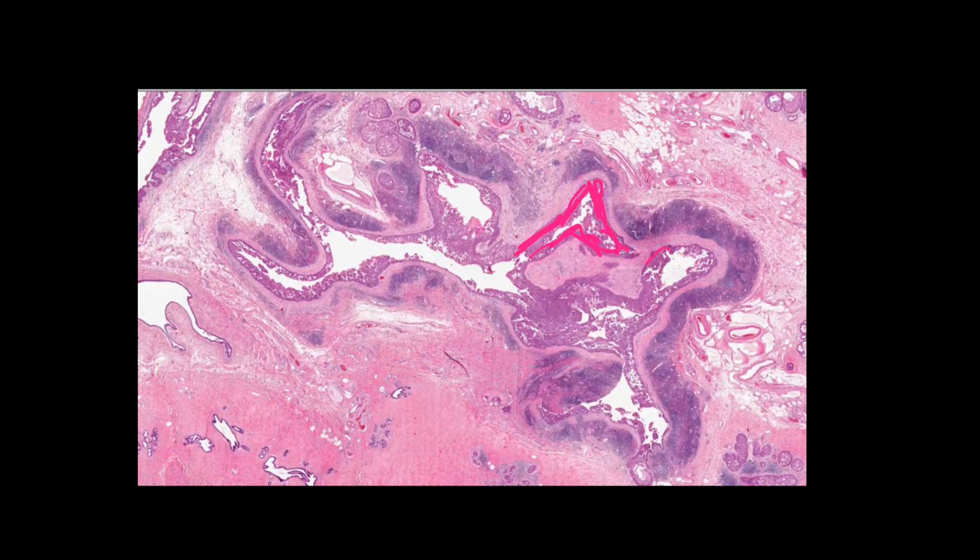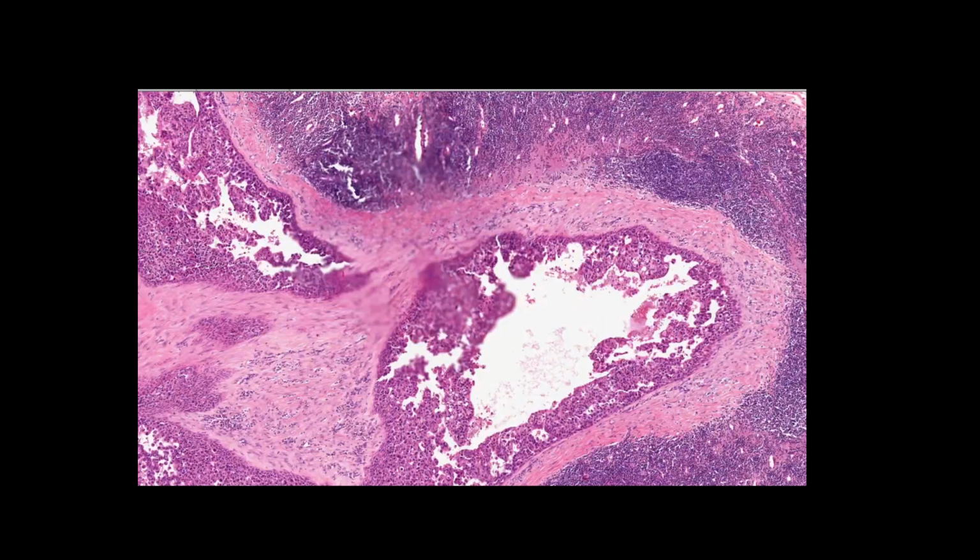Right now, I am outlining the cancer cells which are inside the basement membrane. Out of these cancer cells, fake fibroblasts, so-called desmoplastic reaction, is going to develop through epithelial mesenchymal transition, EMT. And then we see also the thick lymphocytic infiltration around the ducts. These are not her own pre-existing ducts. These are neoducts. They are newly formed by cancer. That's why they are so disorganized, contorted.